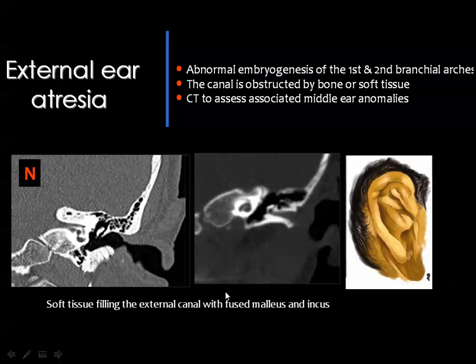We remember that the external canal is filled normally with air, which is continuous through the external meatus with the exterior, and it terminates by the tympanic membrane, which is fixed to the tympanic annulus, and you may find some soft tissue densities within the canal representing earwax.